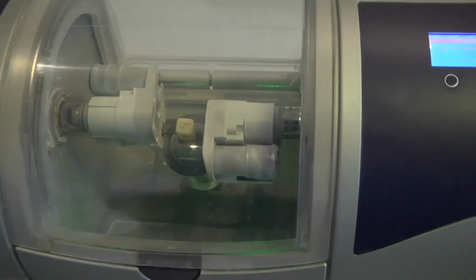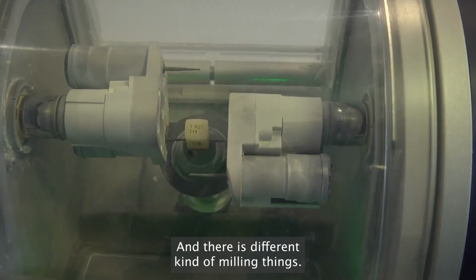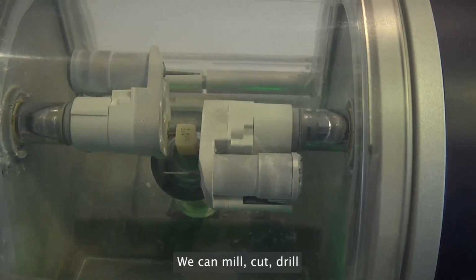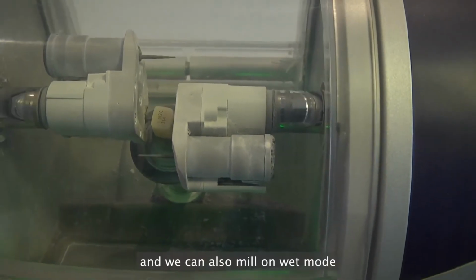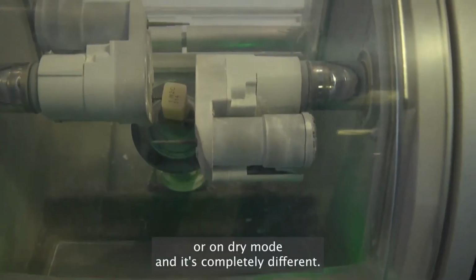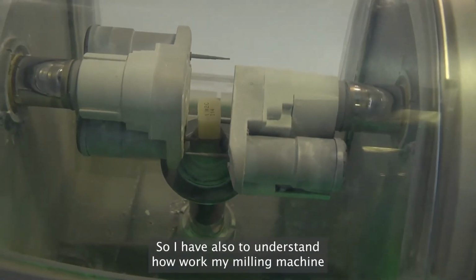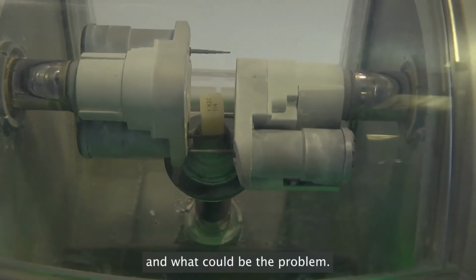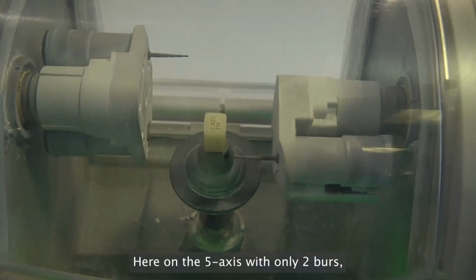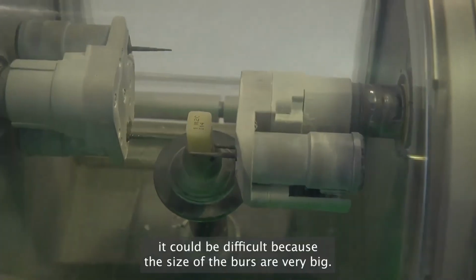But it's exactly the same on all kinds of milling processes. And there are different kinds of milling operations. We can mill, cut, drill, and we can also mill in wet mode or in dry mode. And it's completely different. So I also have to understand how my milling machine works and what could be the problem.